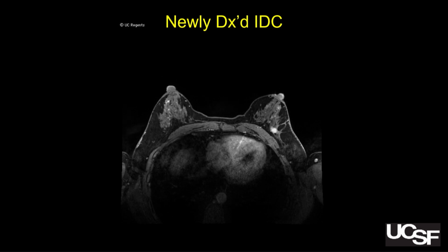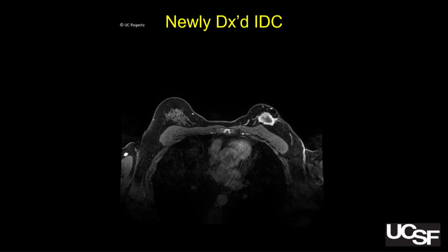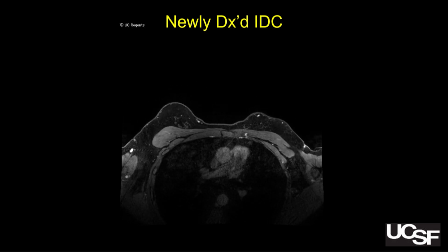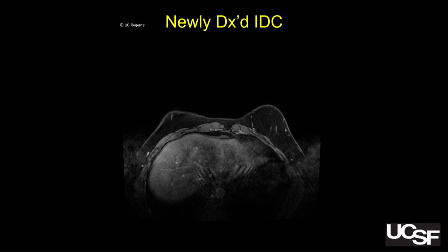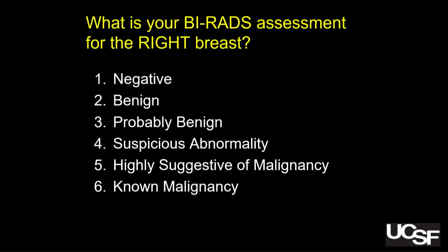But, just take it systematically. Take one breast at a time, one side at a time, start counting up dots. This is why it's so important to try to figure out what's background, and then you can think about what you want to go after. Okay, so a lot going on. Just a show of hands so you get some physical activity. How many of you would recall something on the right or think there's something going on the right? Anybody? Probably everyone is too busy looking at the left, forgot about the right.